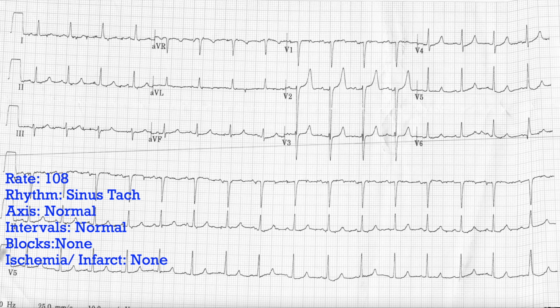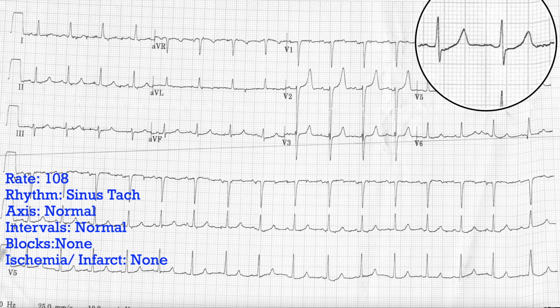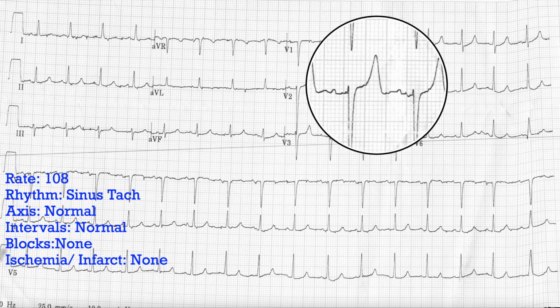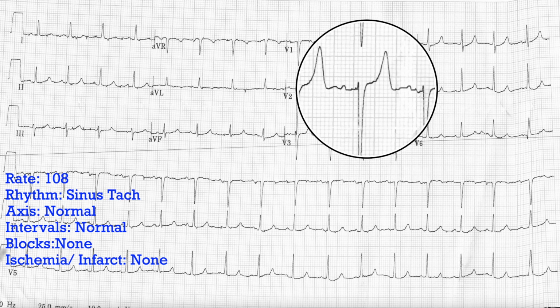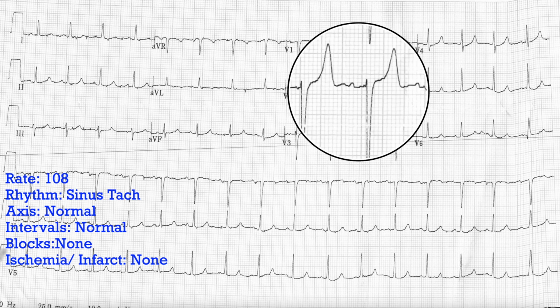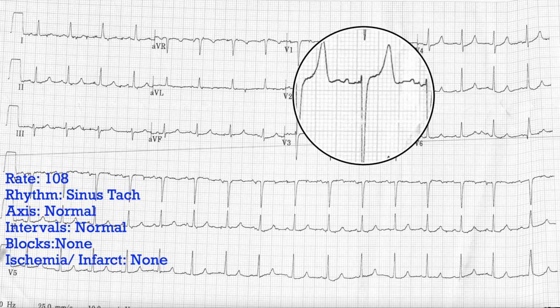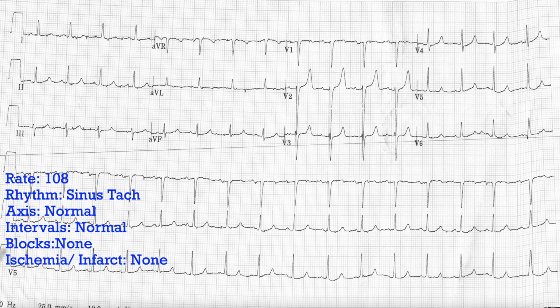Now, the couple of things that you don't see on this EKG that sometimes you will see with severe hyperkalemia: the peaked T wave is the first thing, but the peaked T wave just says that it's high. When you really get worried about it is when you get QRS widening. If you remember the changes, it's like pulling on a string: you pull apart the whole complex, grab on each end, and it flattens the P wave, it makes the QRS wide, and eventually gets to that sine wave thing. We don't see that here, we just see the peaked T waves.